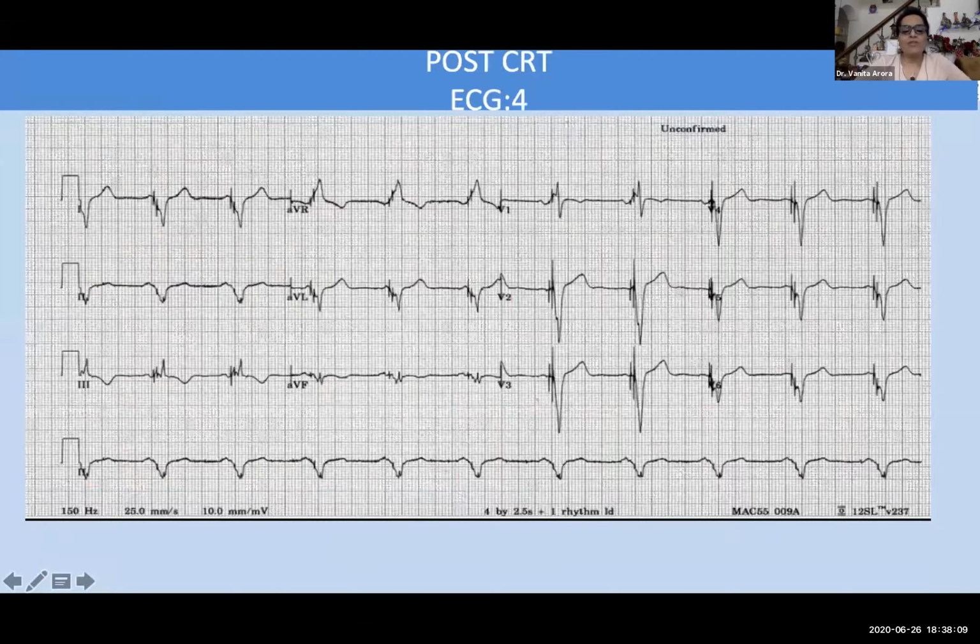Okay, can I have the question here, please? Patrick, please. I think the question is wrong. The question is, what do you think is the pacing here? Is it a good pacing? I think the question is wrong. So you can just answer whether you think it is a true CRT pacing, true BIV pacing. Let that be the question which you have to answer.